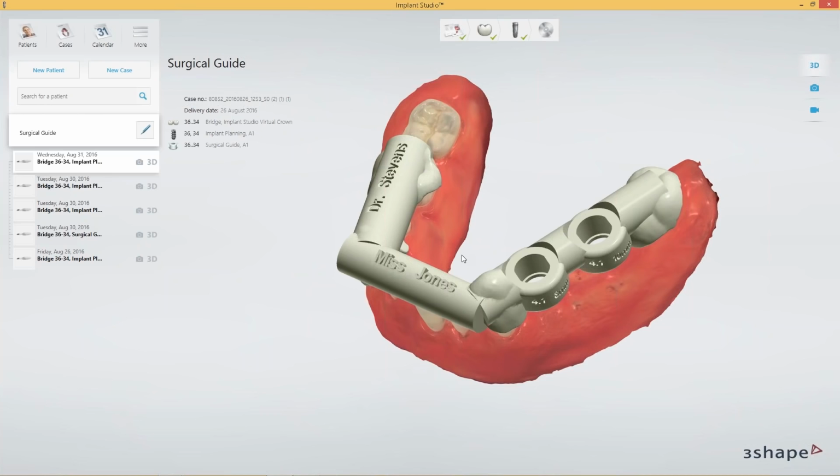It's quite a delicate design, actually. It gives a very robust impression as a user, but the real point is, once again, it does exactly what it's supposed to do. And you said it earlier, what is very interesting about this design is that it's very easy and straight to design. You do not spend much time, and these cylinder-shaped geometries with undercuts for the teeth are going to give a lot of stability to the guide.